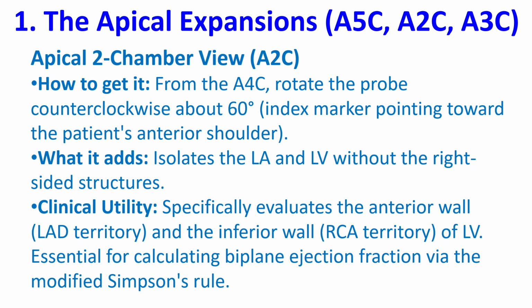Isolates the LA and LV without the right-sided structures. Specifically evaluates the anterior wall, LAD territory, and the inferior wall, RCA territory, of the left ventricle, essential for calculating biplane ejection fraction via the modified Simpson's rule.